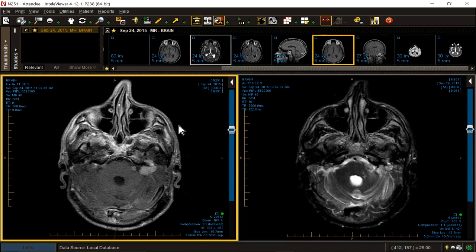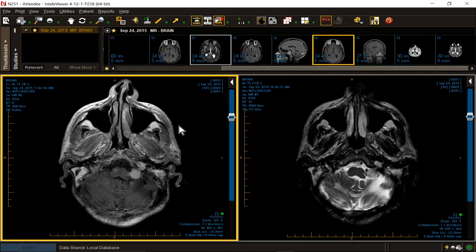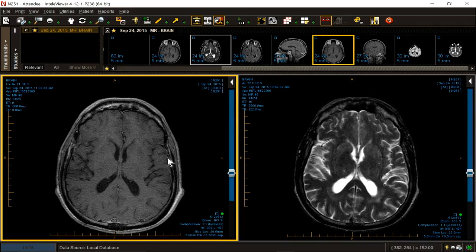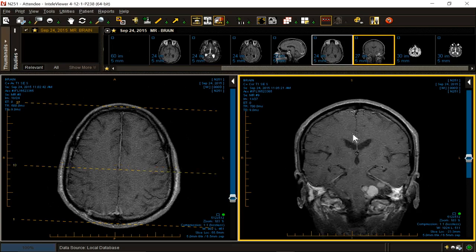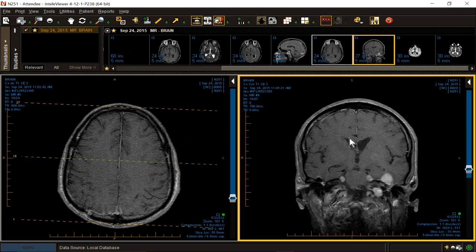He's 55 years old. He's deaf. He's had both 7th and 8th nerve complexes resected. And he's got nodules everywhere, and they're enhancing. So now your job is to figure out, the diagnosis is already known, are these nodules in this NF2 patient meningeal, or are they cranial nerve related? Which means you've got to know where all the cranial nerves are. So it's an excellent exercise in anatomy.